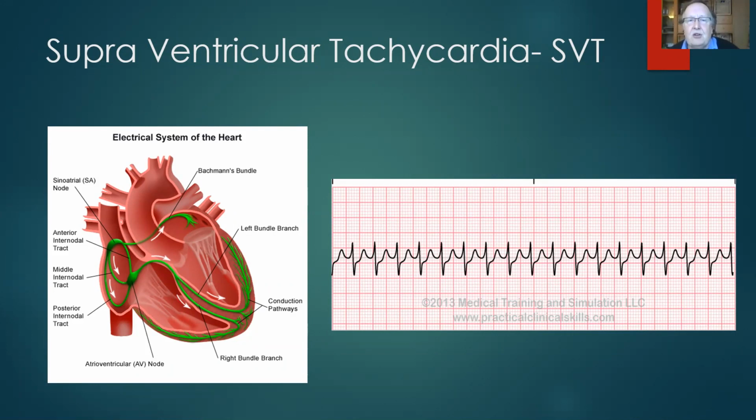So we can ignore some of the other questions. So the next question is, is the QRS complex of normal duration, 1 to 3 small squares? Yes, it is. Is the ST segment isoelectric? Yes, it is. And is the T wave the right way up?